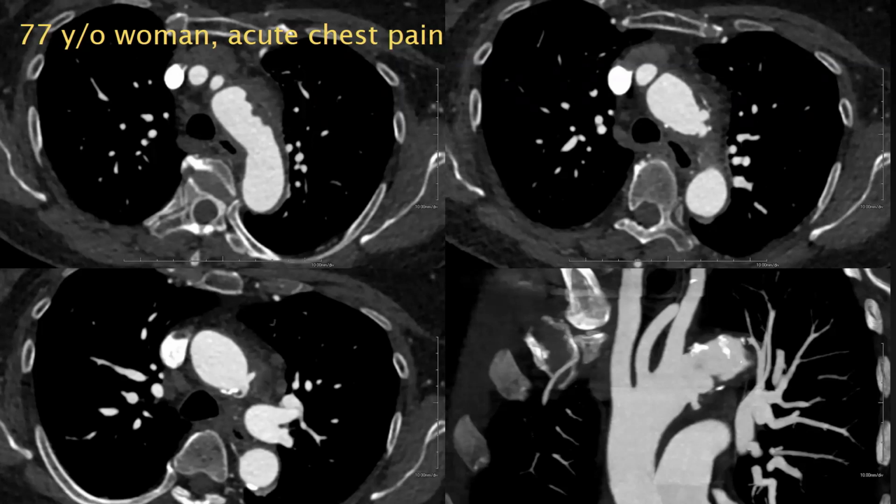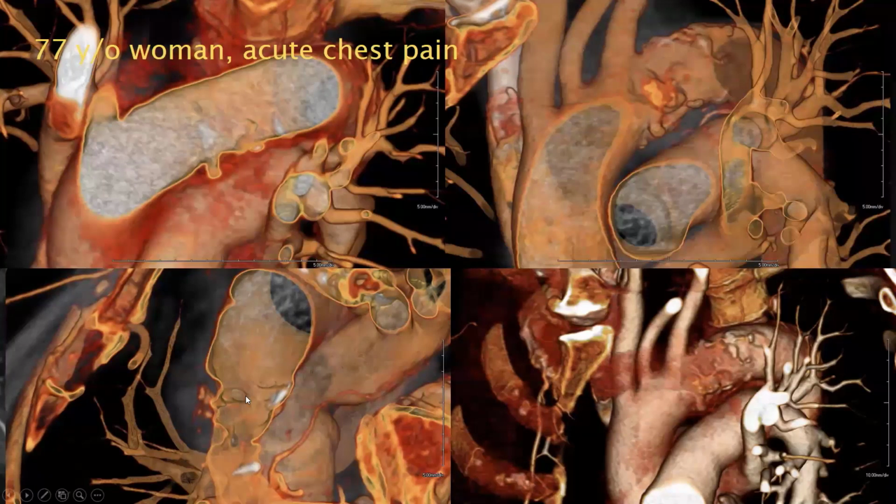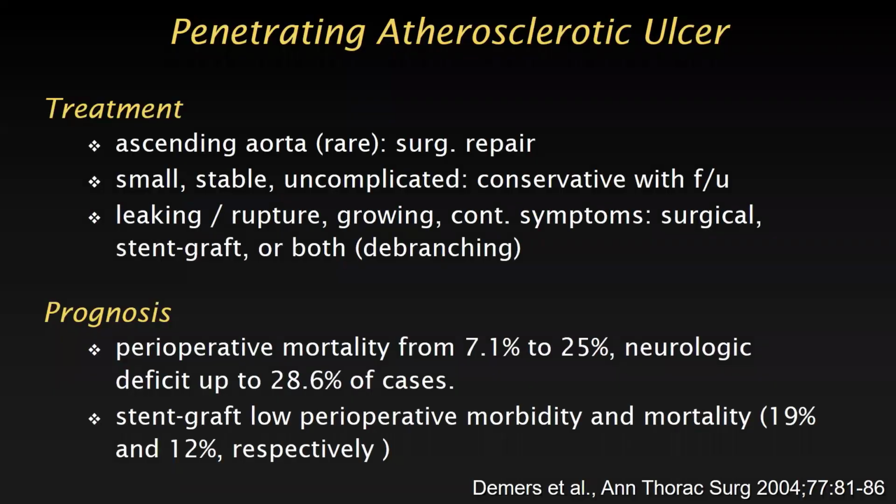Again, we would call this type B because it does not involve the ascending aorta. Some 3D images just show the same. Here's the ulcer with the little periaortic blood here. This is a view from above. I'm just trying to give you a view down into this barrel here, into this ulcer that penetrated through the aortic wall. There are just some 3Ds showing you the atherosclerotic disease in this area with this one penetrating atherosclerotic ulcer here. So that's, again, a nice example of an acute penetrating atherosclerotic ulcer.